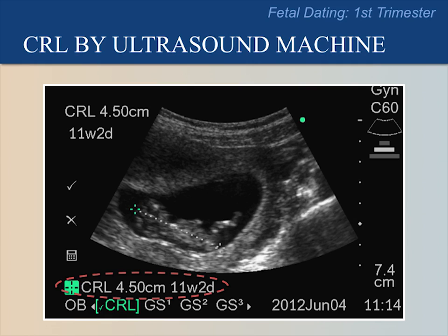Now consider the fetus in this image. Is this fetus in an ideal position for the measurement of crown rump length? Please pause the video to encourage responses.